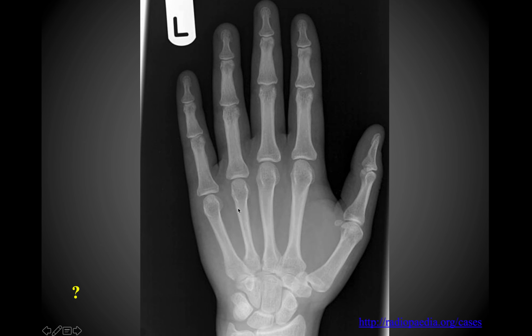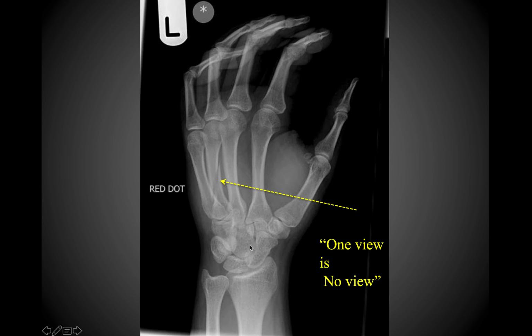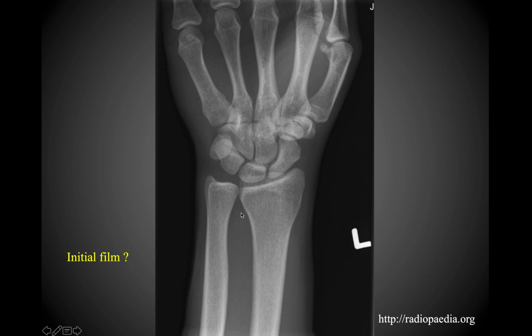because if you go back an image, it looks a little skinnier perhaps than the others, but you don't see any obvious evidence of a fracture. So once you look on that oblique view, now you can see very clear and obvious evidence of a fracture in this individual. So now here we have another plain film.